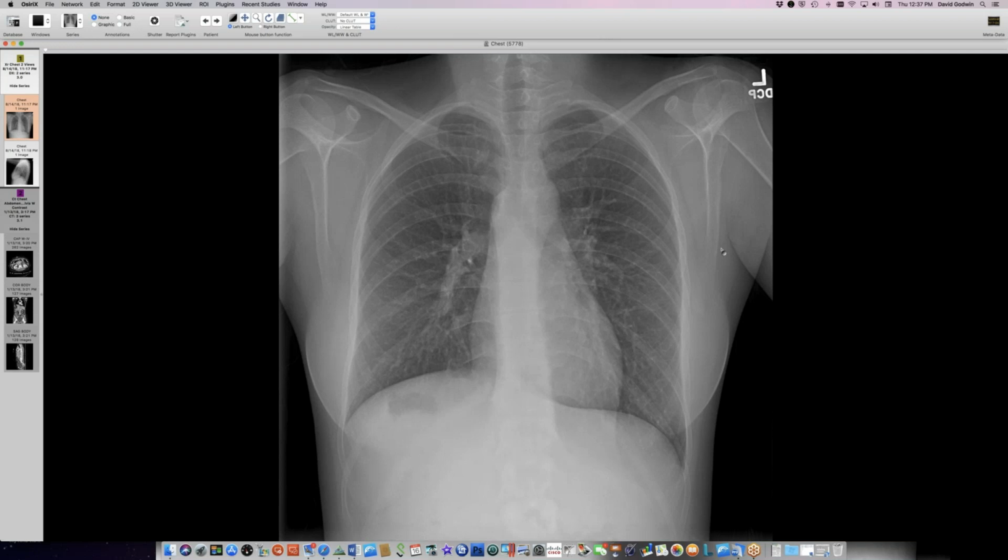And then, is there something odd about the trachea? Does it narrow a little bit? Yeah, that's what I was wondering too. Through here. A bit narrow, segmentally. So let's see what else.